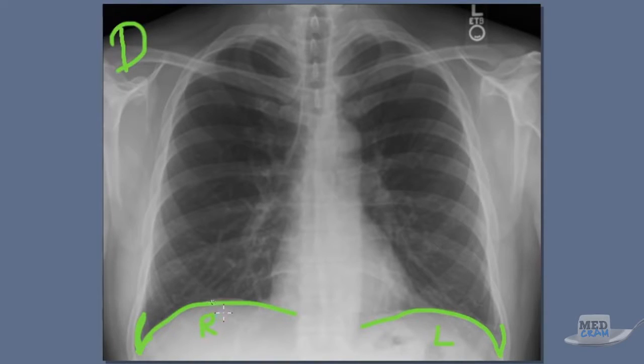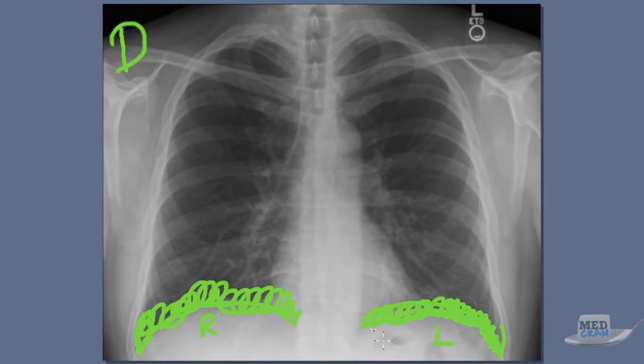The highest point on the right here should be right in the middle, and the highest point on the left should be slightly lateral to the mid-lung, so kind of in this area here. But it's not a hard and fast rule. Generally speaking, this should be smooth. Now, if there is loss of this, the same principle applies. We now have two things basically interacting with each other, abutting each other with the same density. And if it's in this area, this is going to be a right lower lobe pneumonia. And if it's on this side, this is going to be a left lower lobe pneumonia.